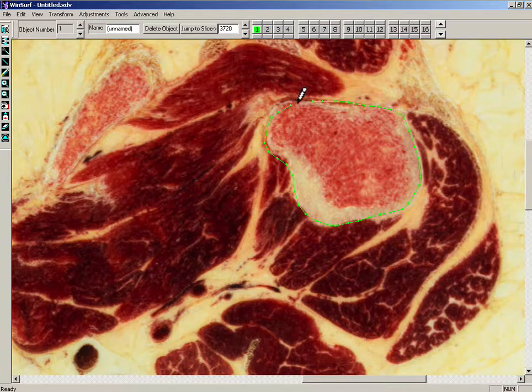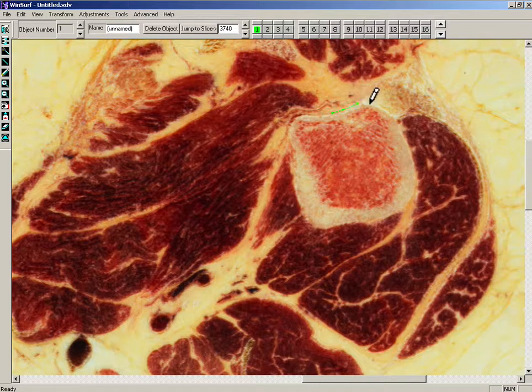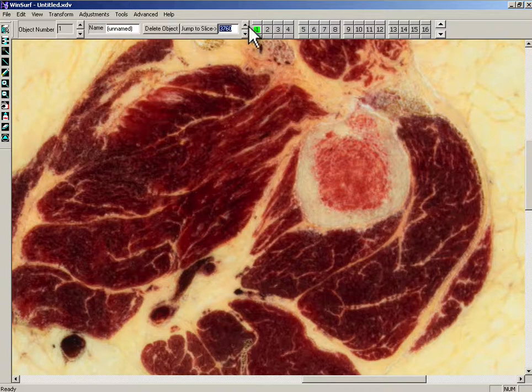And then I go down again, and this is the beginning of the femoral diaphysis. I go down again and show you what happens if you have now a shape which is really the shape of the femur bone. Now I click 3D.